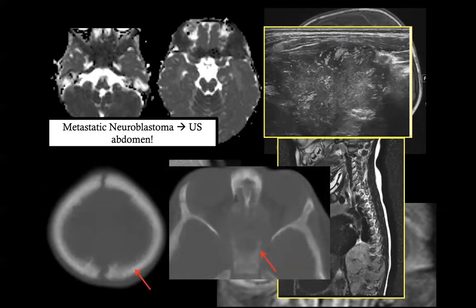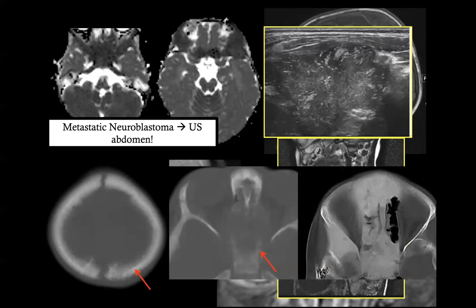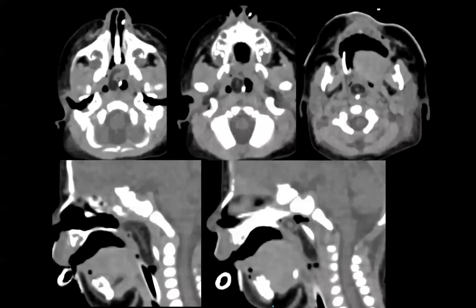And also remember the permeative appearances on CT, and this is the other side of the spectrum. LCH was lytic. Look at the fibrous dysplasia, very solid. So again, we have three different appearances on CT. Key radiological finding number 3, the fat is very important.